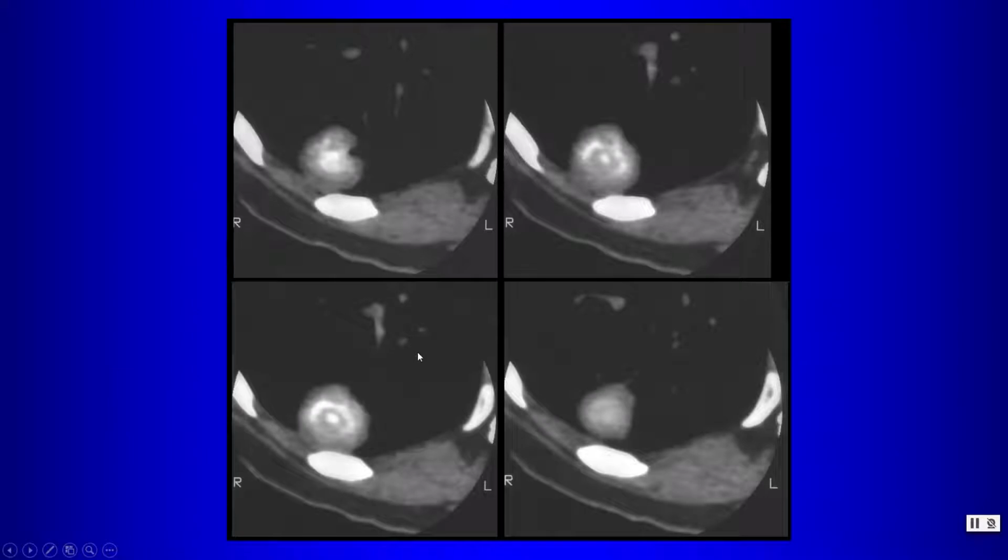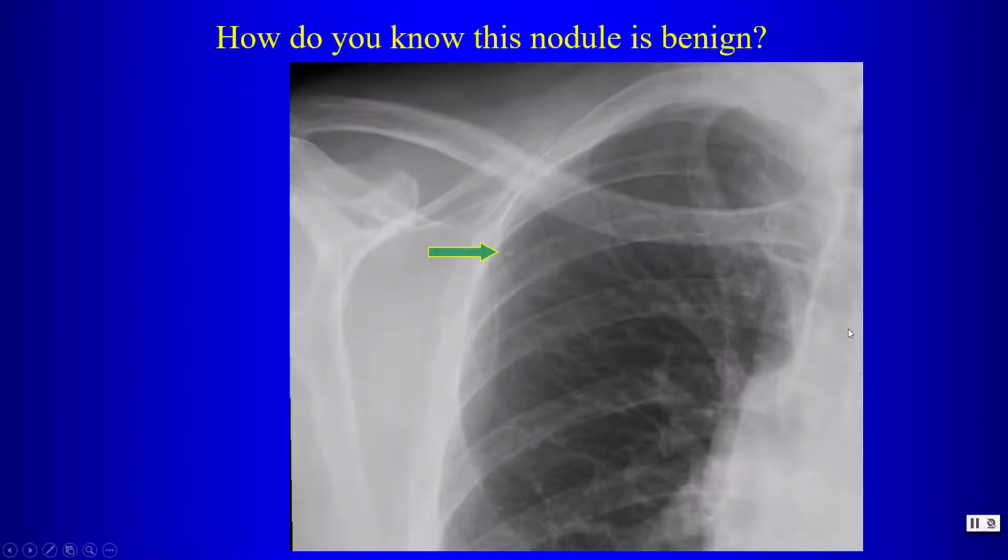When we look at this next case, here again we have a nodule with some central calcification, but notice also that we have this peripheral ring-like calcification in this nodule. This particular appearance is specific for a particular entity. I'll give you a second to think about it. What do you think this is? This is a histoplasmoma. So this ring-like peripheral calcification is specific for histoplasmoma.